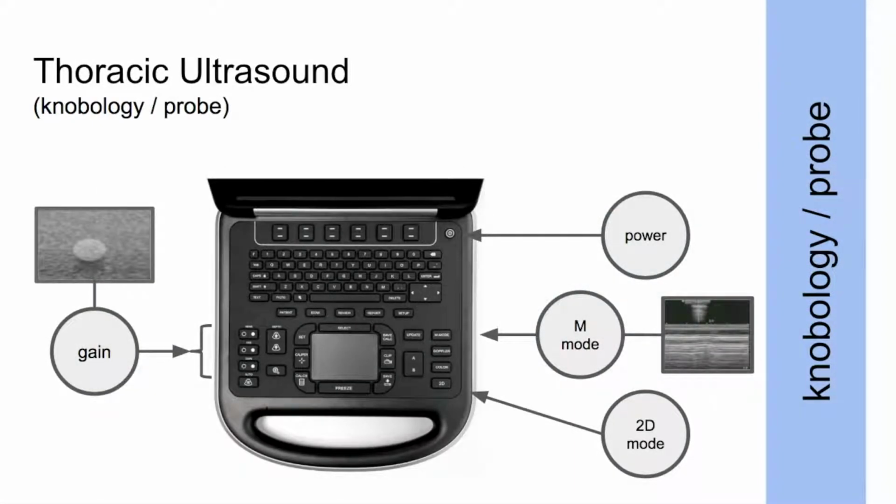This is what the basic keyboard of an ultrasound machine looks like. For this lesson, we will concentrate on 4 functions. It is important to get to know your ultrasound machine before attempting a bedside exam. Nothing looks worse than an unprepared clinician fumbling away with knobs and buttons. You might be the best ultrasonographer in the world, but if you don't know where the power button is, your credibility and reputation can be jeopardized.